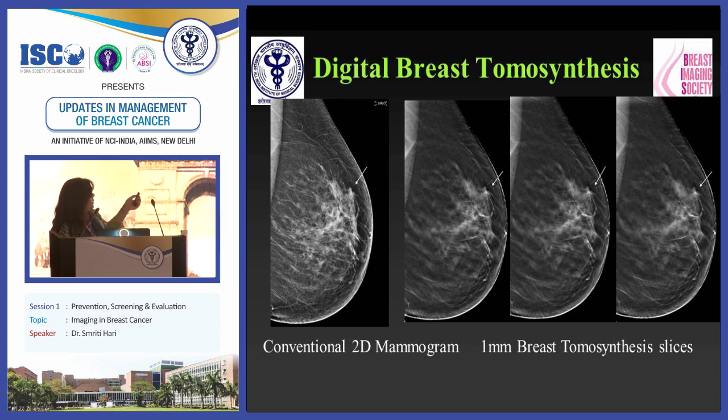The first one is a conventional image, which is not showing the cancer very well, shown by the arrow, but which could be seen very well on the tomosynthesis image, along with its characteristic spiculations.